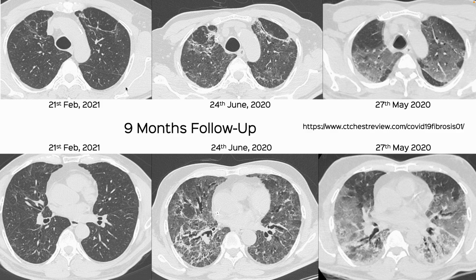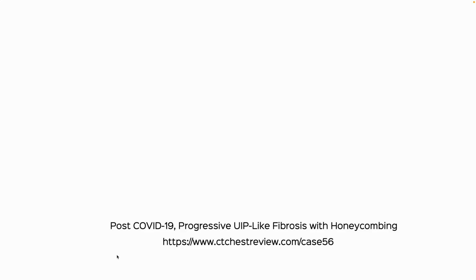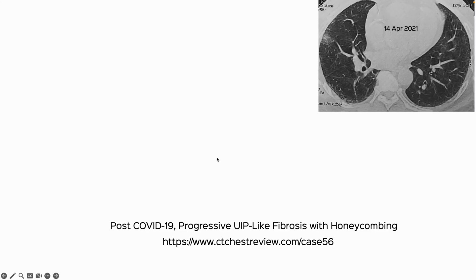Now, if you take COVID 19 as an example of this pattern, here is exudative phase involvement in May 20. In June 20, this is the organization phase with reticular opacities, traction bronchiectasis, little residual ground glass. And remember, in June 20, we all thought we'd be faced with a tsunami of cases of fibrosis, but then we learned by Feb 21 that the vast majority of them seem to improve. So that's the healing phase or the repair phase where everything's improved. It doesn't happen with everyone.